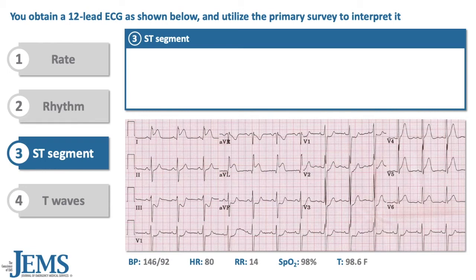Next, we will have to examine the ST segments to see if they fall in the same plane with the isoelectric line, that is the baseline, looking specifically for elevation that would indicate infarction, which is the death of myocardial cells, or depression, which could indicate ischemia, inadequate blood supply, or infarction in the case of a non-ST elevated myocardial infarction or NSTEMI. which we would need cardiac enzymes to confirm, so don't worry about it in the field. The receiving hospital will determine that. Suffice it to say, if you see evidence of NSTEMI, it's best to consider it so until proven otherwise.